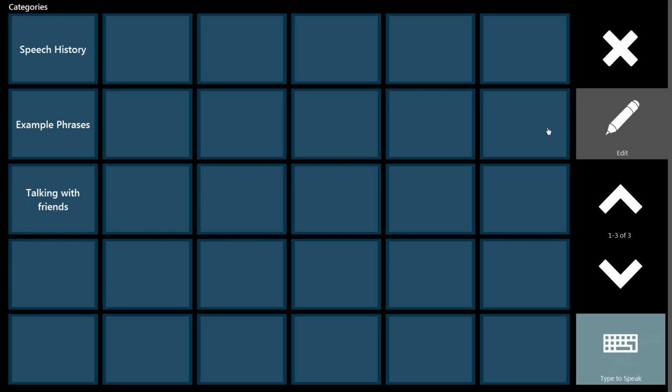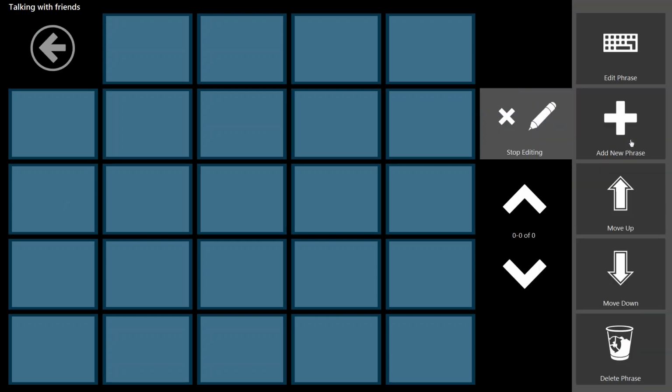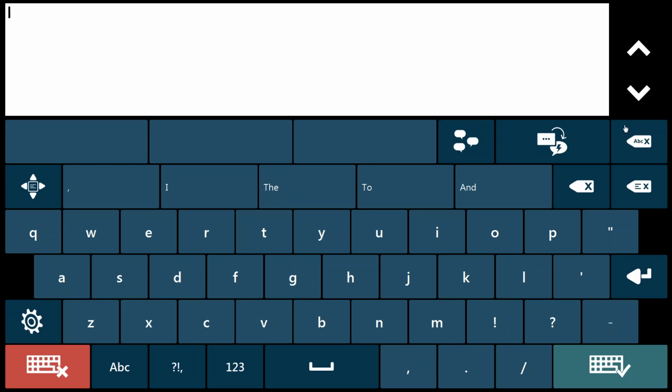I can say stop editing, and then I can actually go into that category. And now there's just a bunch of blank spaces for me to add messages that are important. So I can say edit, add a new phrase, and I can say, hey girl, what's up?